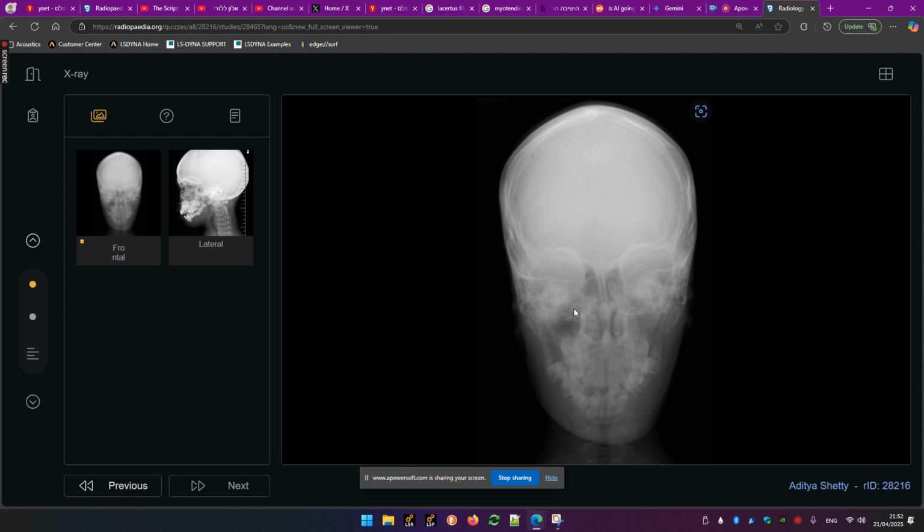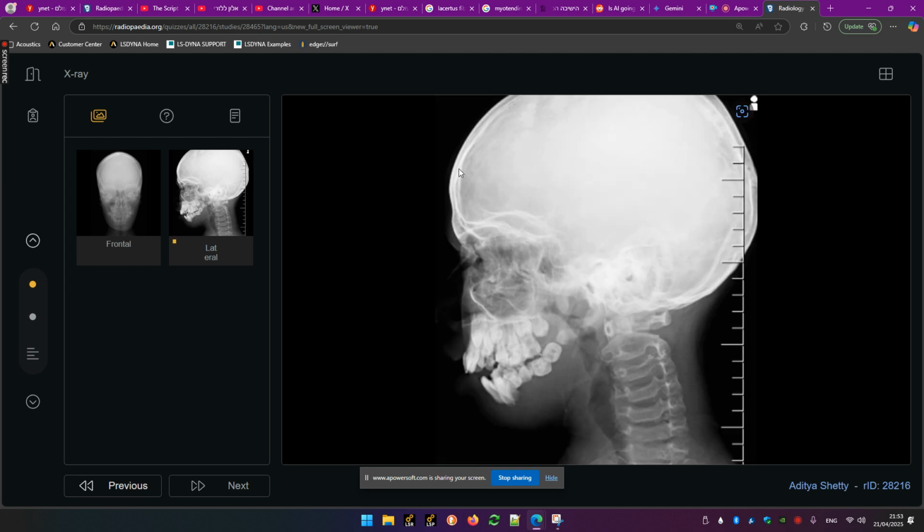Here is the area of the concha. The skull seems quite fine, I cannot see any fractures. On the lateral view, again, here is the sphenoid sinus, the maxillary sinuses. Of course, the teeth show nothing to tell you about an abscess. Maybe here's some impacted molar tooth. Except for this, there is no cyst around it.